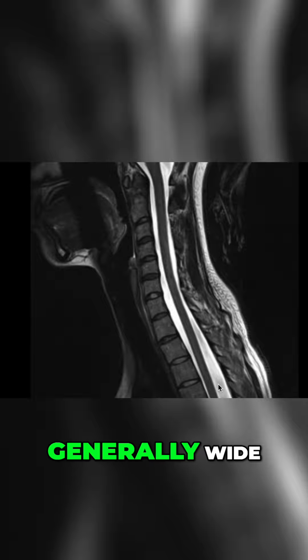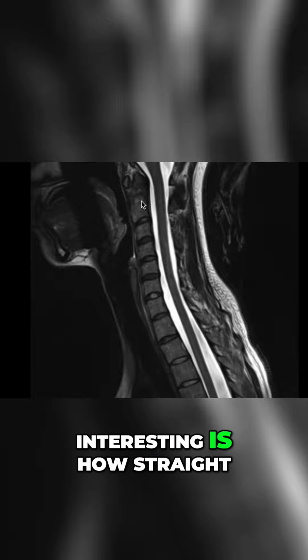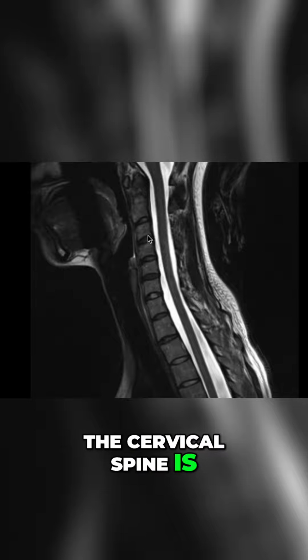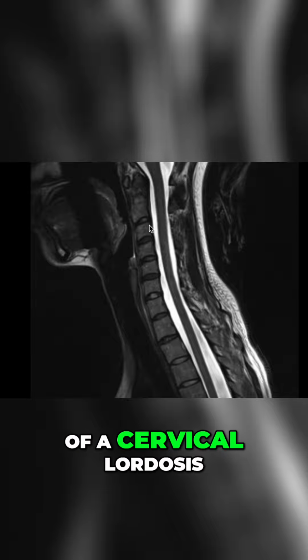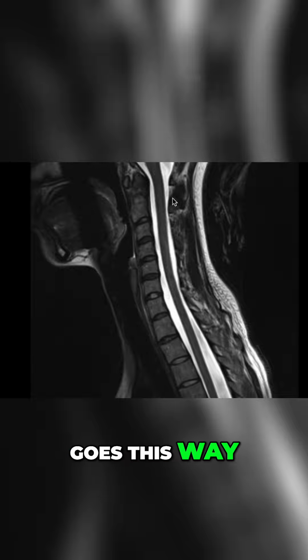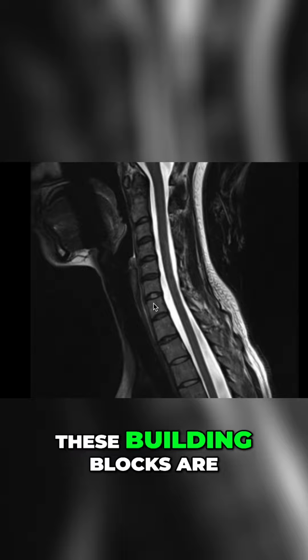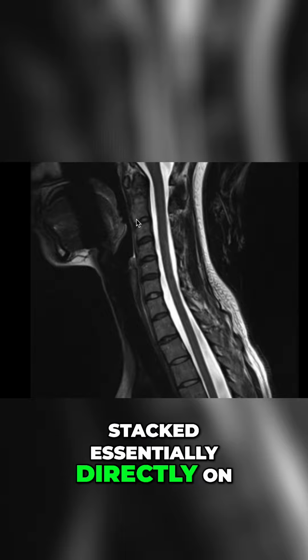The canal here is generally wide, which is a feature, but what is also interesting is how straight the cervical spine is. Normally there's a little bit of a cervical lordosis, so the curve kind of goes this way, where the concave side is on the right side. But as you can tell here, these building blocks are stacked essentially directly on top of each other.